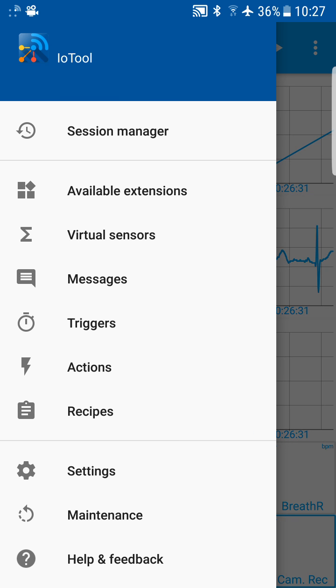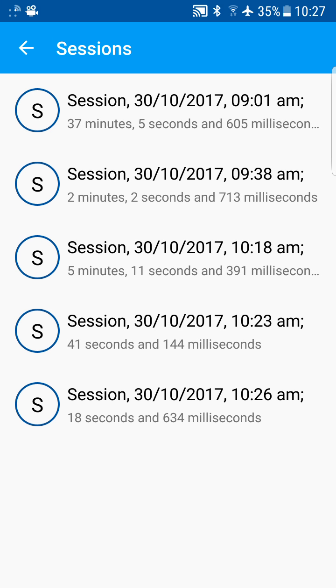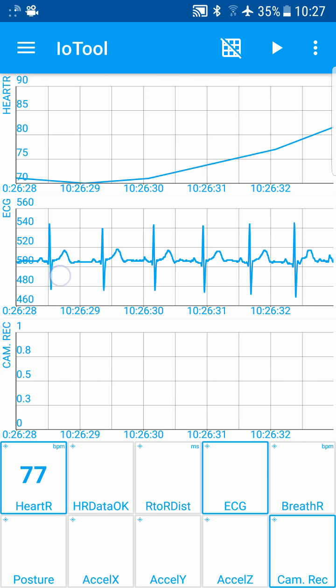So you can go to Session Manager and find sessions corresponding to specific readings you produced in one time frame. So for example, this session started at 9:01 and we can check that session. Or again, the last one, let's check it. Oh, we have ECG here.